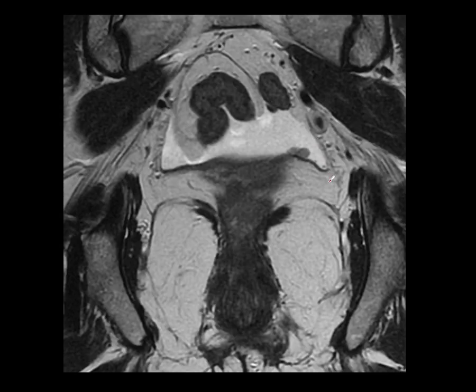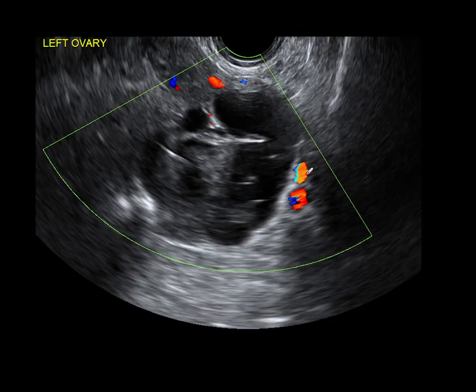But it wasn't very obvious on the ultrasound. It was quite difficult to evaluate. Here's a peritoneal tumour deposit, which we can see in the pelvis, same patient, and this is outlined against this fluid. So if I was just to go back here, this just isn't very easy, is it? There's not much flow internally. There's a solid element, some cystic component, slightly lobulated margin, but not very easy.